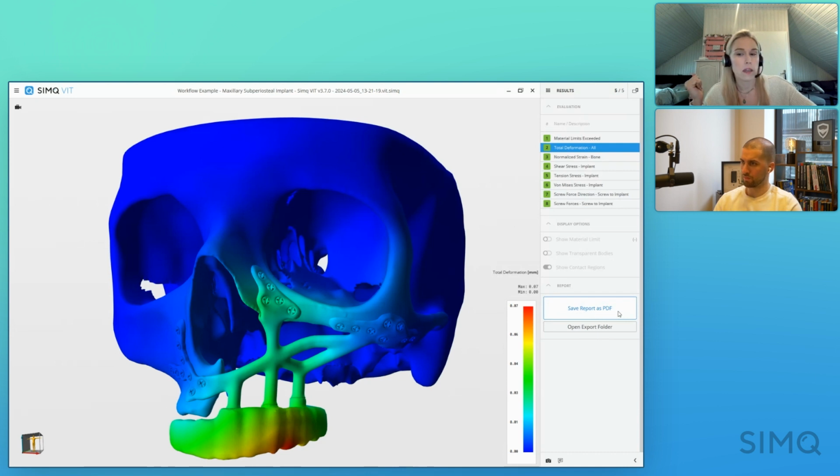Really cool. And then here's the handy dandy PDF report that you can print. So you click that and it generates all of the facts that I shared with you in a report. So it can go into your QM systems, and like with MDR regulations, you have to have certain documentation on things. So it shows why you designed with what material in this way. That makes sense.